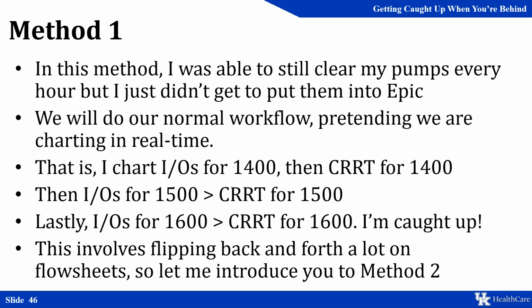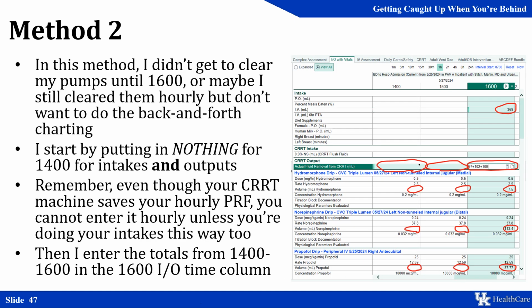There is a second method, however. Method 2 is a little bit faster, so to speak, but it's more error-prone, so make sure you know what you're doing if you choose to do it. While we were gone, we weren't able to clear our pumps, but we knew our rates. So you can see in our screenshot here, we have the rates charted, but we have unchecked the volume.